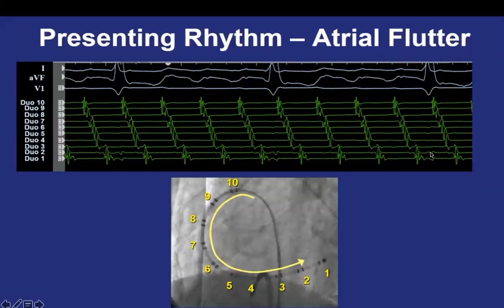So you'll find this one is only available whenever you have the QRS, and that's what I mentioned a while ago. If you put your catheter in an atrial position, you are not going to record the ventricular activity, and that's a proof for that. The one recording the ventricle is only 1, 2, almost 1, 2, a bit with 3, while the others are not recording the ventricular activity, because of the position of the catheter. 4:1, sir? Well, 4:1, yes.